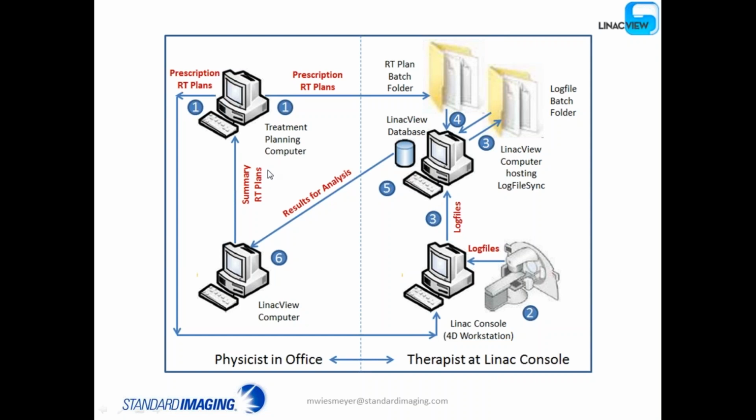And then you can also have a post-treatment analysis. You might consider doing this as an additional value add for your weekly chart checks as a physicist, so you can go through and see what happened for all your patients in terms of fine detail of treatment delivery.